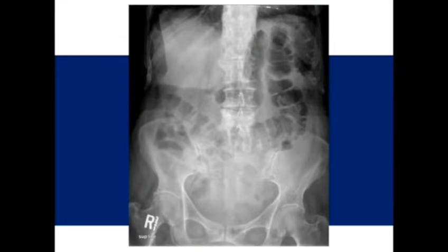This is an example of an abdominal X-ray. So you can see we have the lung up here, which shows up as dark. Inside the bowel loops, we have gas, which shows up as dark. On the other side of the scale, we have dense things like bone that show up as very white. In between the two extremes, we have soft tissues.